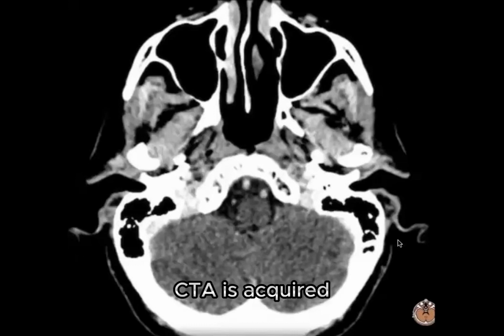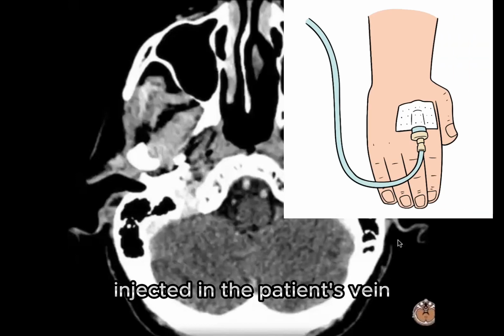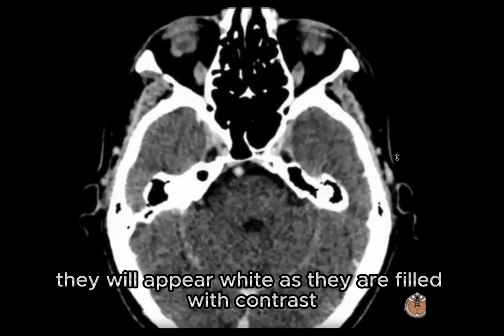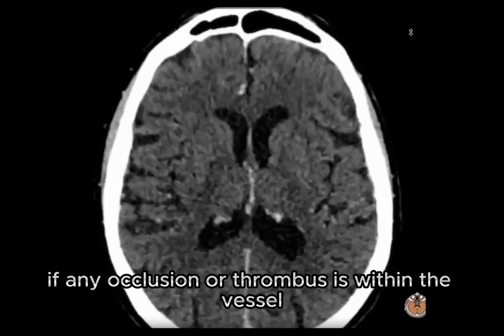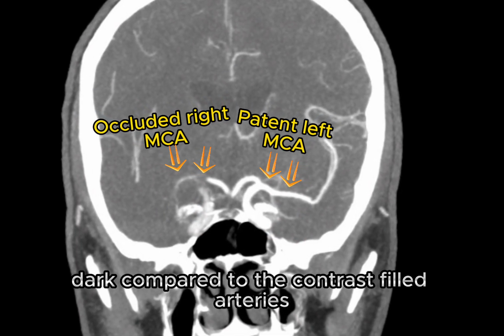CTA is acquired as the vessels are opacified with contrast injected in the patient's vein. As the contrast reaches the intracranial arteries, they will appear white as they are filled with contrast. If any occlusion or thrombus is within the vessel, the thrombus will now appear dark compared to the contrast-filled arteries.